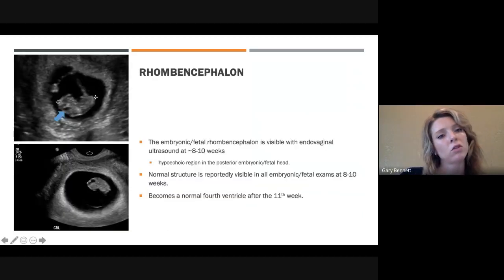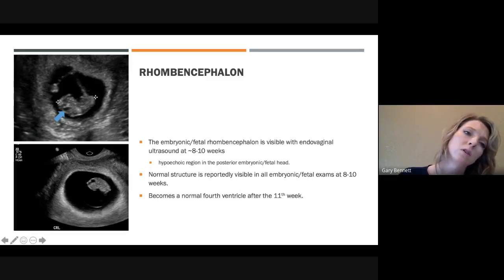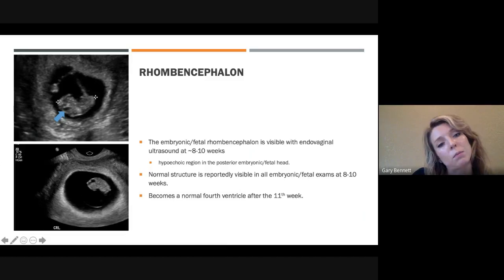Look back through this picture here. So this is probably the amnion. This is not a super clear picture. It was a great picture of the rhombencephalon. Not a great picture in other regards. It almost looks like a twin pregnancy, but it's probably an amnion, and this is probably a corner of the yolk sac. Again, this would be super clear if you were scanning it live, but since we don't have that luxury right now, that's what we're looking at there.